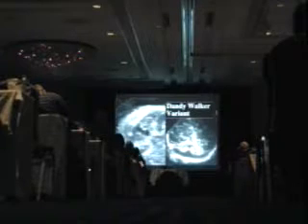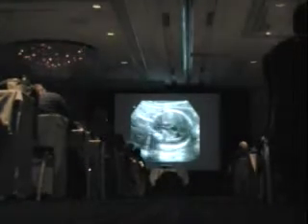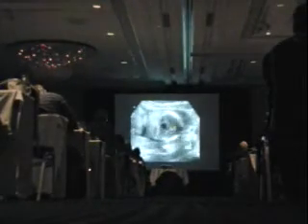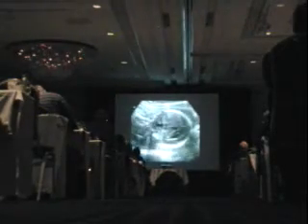And so it's not a Dandy-Walker cyst full-blown. And this is, again, a Dandy-Walker variant, although it's more like a Dandy-Walker cyst because you have that cyst coming out in the back, and you also have agenesis of the corpus callosum.